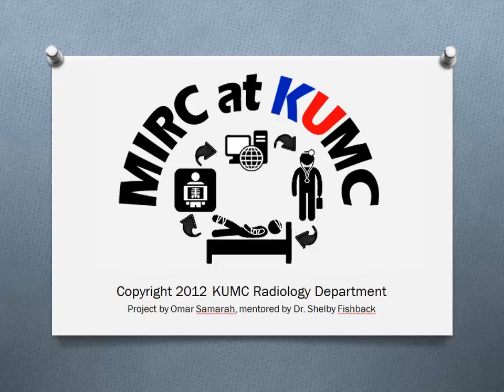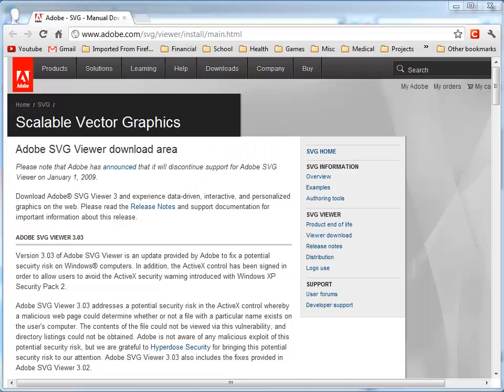The goals of this tutorial are to install the required software, add annotations to an image, and then view your annotations. The first topic is software. You must be on the hospital network in order to install an SVG viewer. This cannot be done remotely through the Citrix gateway, so it's not possible to remotely annotate. Some computers may not be able to annotate images if they do not have an SVG viewer installed.